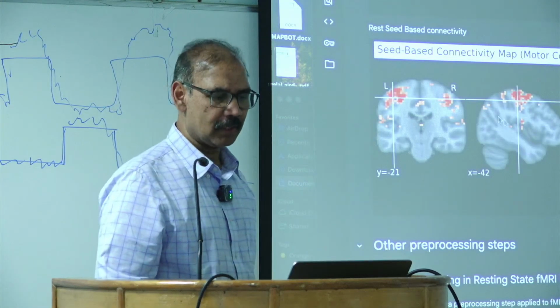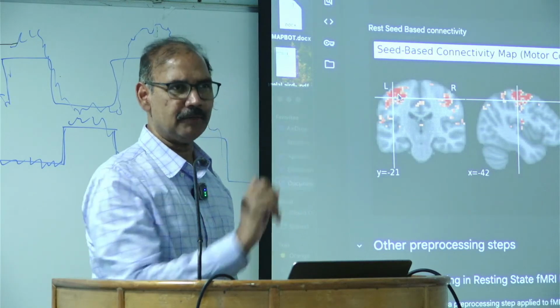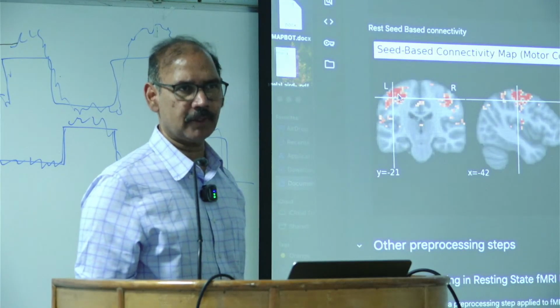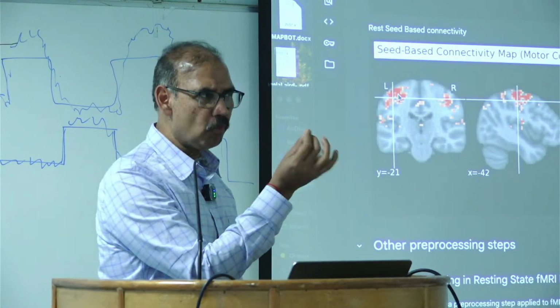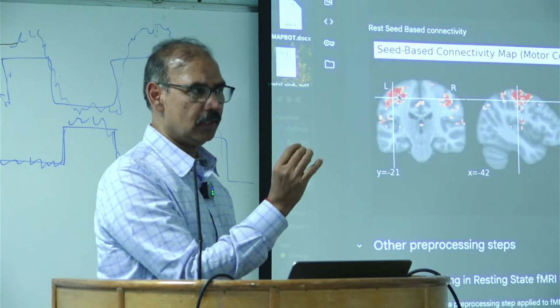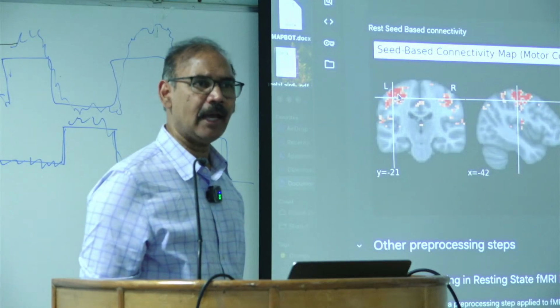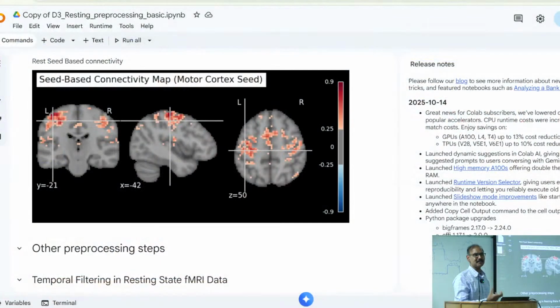So play with the coordinates, try to change a little bit here and there, and see how much variation you get. Move it by 1 voxel, and see, are you seeing the same? I really want you to get an intuitive feeling about this connectivity. Later, what we are going to do is, again, this is on the raw data.